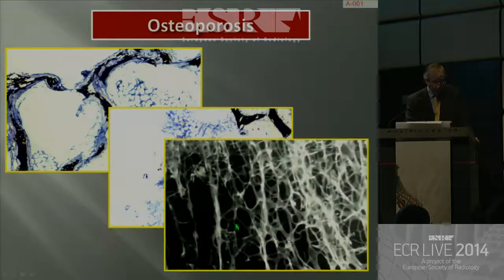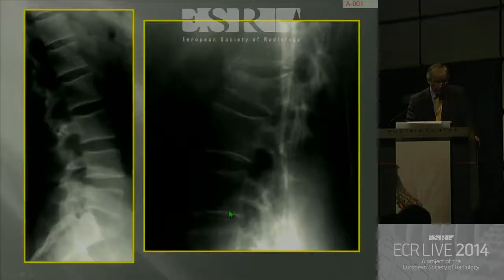And this is a microfocal of a patient with osteoporosis, and you can see the absence of trabeculae. You may also notice that there is actually a fracture of the trabeculum with a little callus formation around it. So here we have a normal bone, but less of it. And the classic picture, of course, is the pencil outline of the bone compared to the normal. This is the normal, this is the abnormal, the very sharp pencil line, loss of bone density. But remember that bone density can appear to be affected by the radiographic exposure, so do be careful when you're making a diagnosis of osteoporosis.